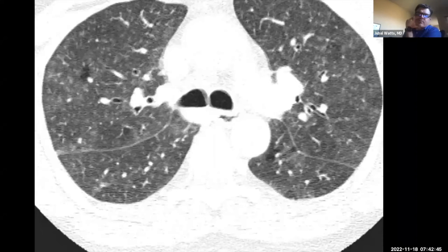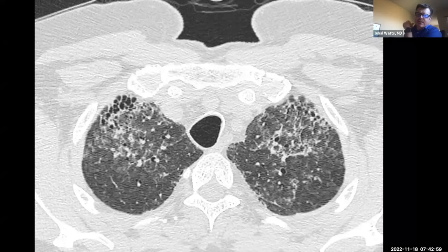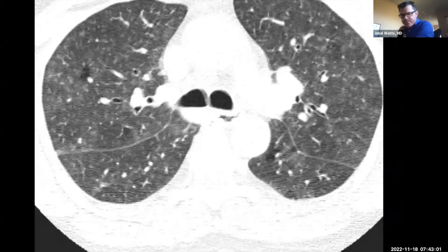One thing that's important to differentiate, because it can also give you these centrilobular nodules, is hypersensitivity pneumonitis. So HP gives you poorly defined centrilobular nodules, can look similar to RBILD with the ground glass densities you can see in DIP also, but they tend not to have as much emphysema, and they tend to have a lot more conspicuous air trapping.